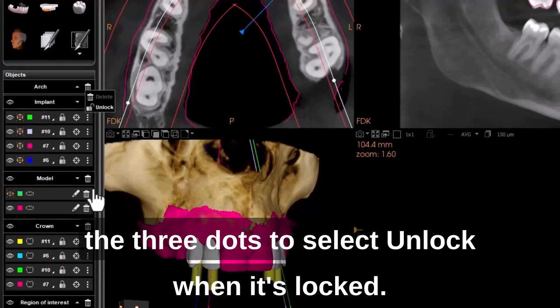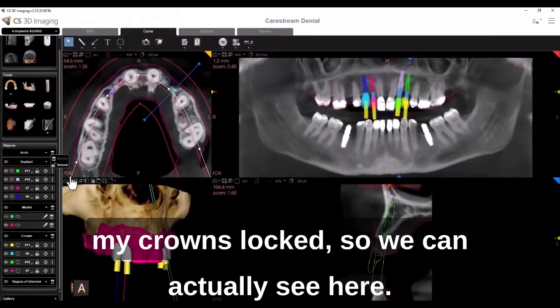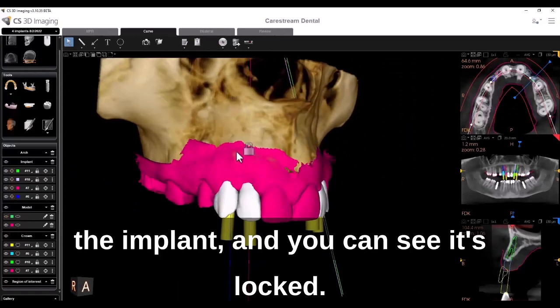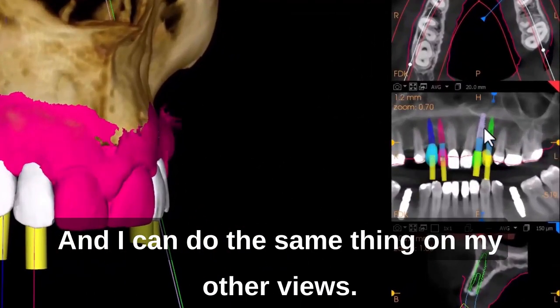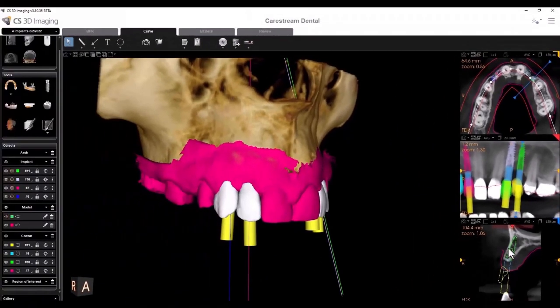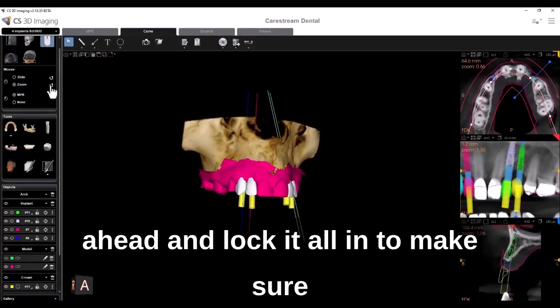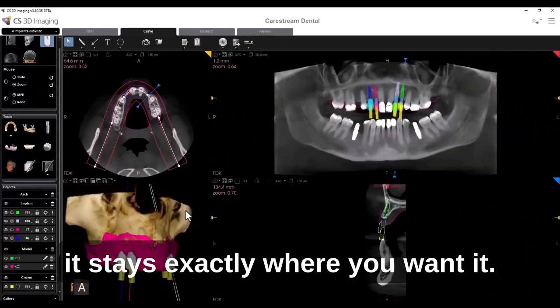When it's locked, so now we've got all my implants locked, all my crowns locked. So we can actually see here, when I move my mouse over my crown, you can see it's locked. And it's on top of the implant, and you can see it's locked. And I can do the same thing on my other views. You can see the little lock as I zoom in. So that's nice, very helpful. Once you create your treatment plan, of course, you can go ahead and lock it all in to make sure it stays exactly where you want it.